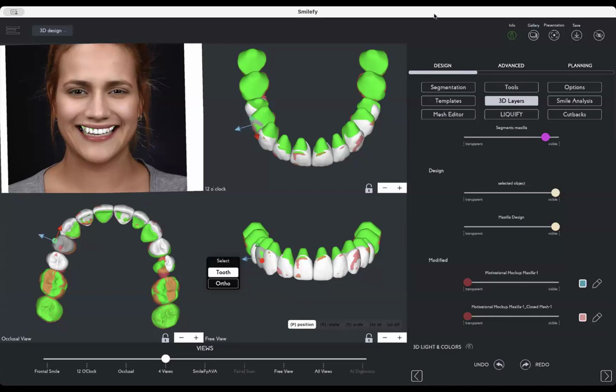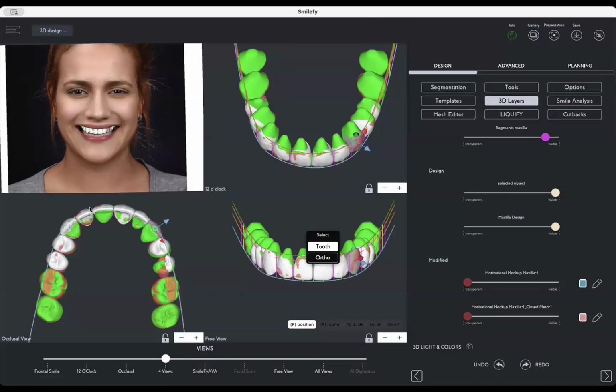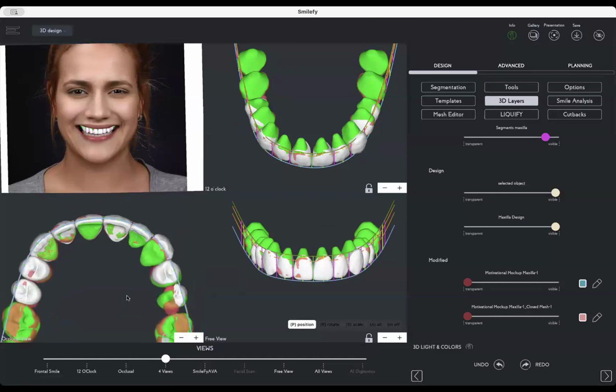Young female patient came, I want new veneers, I want Botox, because the lip is not symmetric. The upper lip was not symmetric. On one side, the upper lip was pushed up. CBCT, intraoral scan, the composite veneers that she had, the canine here was not following a set occlusal curve. It was done manually, and the canine was like this. You see?